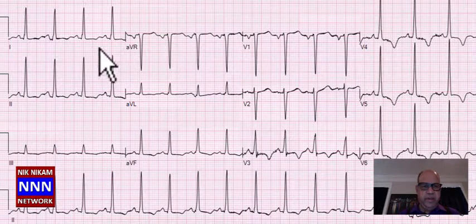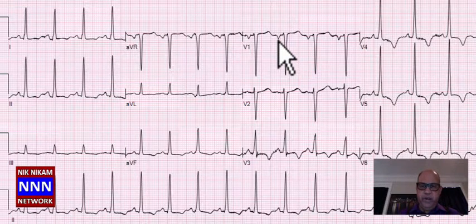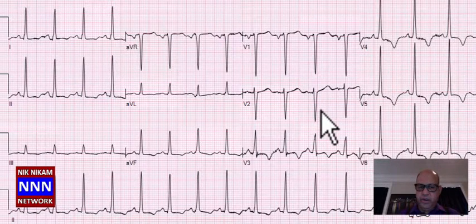Here is a different electrocardiogram which has a lot of interesting findings. First thing, this is sinus rhythm. Number two, you see increased voltage broadly throughout the electrocardiogram. The negative deflection in the atrial wave is occupying more than one box, so this is suggestive of left atrial enlargement. There is increased voltage in the anterior and lateral leads, suggestive of left ventricular hypertrophy.